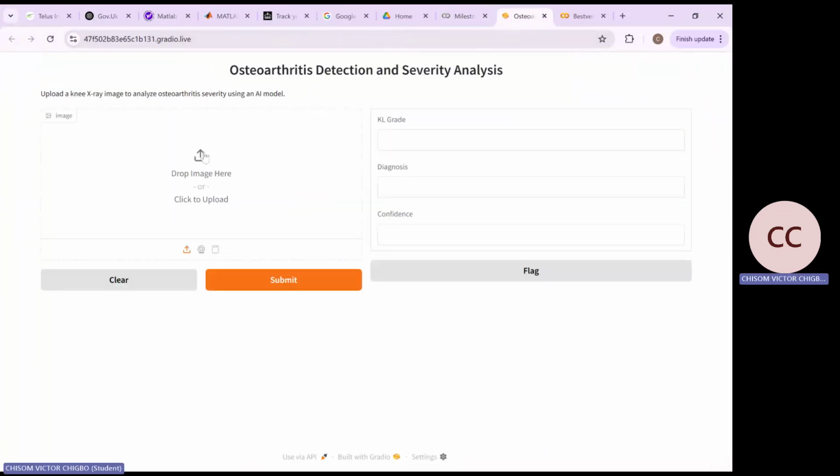So in this new tab, you should already have your file that you want to analyze, okay? You're going to submit it on this tab, but first you have to paste it here, all right? So I click on this, and sorry, I was working on it, so it will jump right at you. This is an auto test folder. This folder was not used in the training or the validation of my model, right?